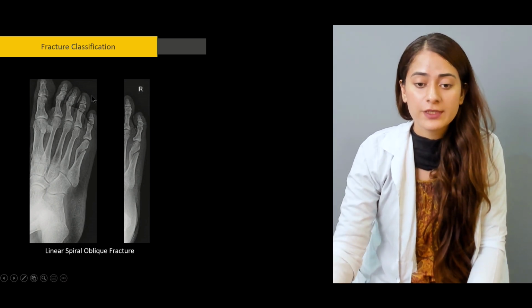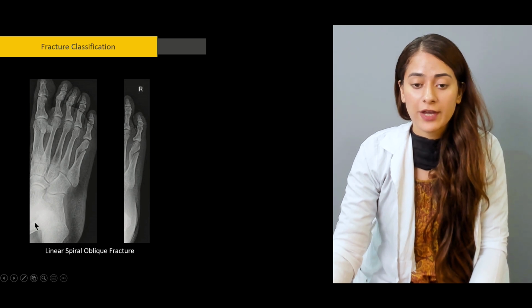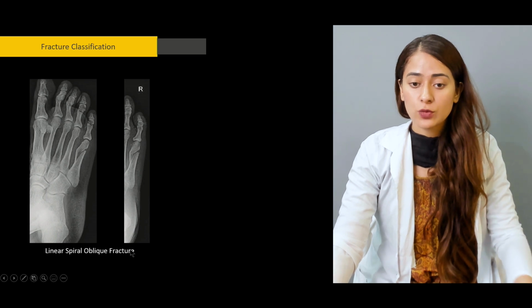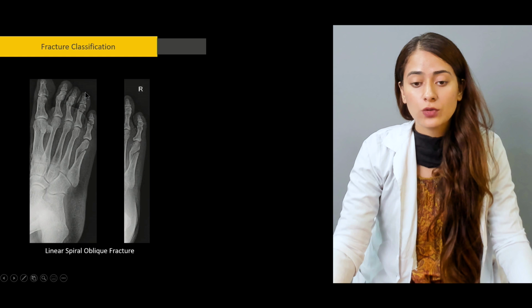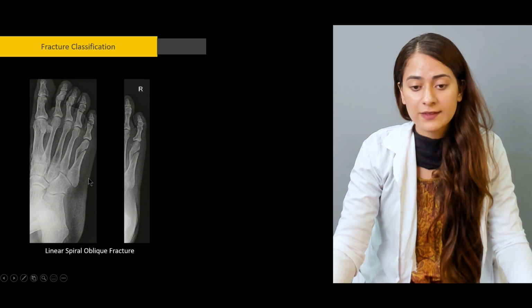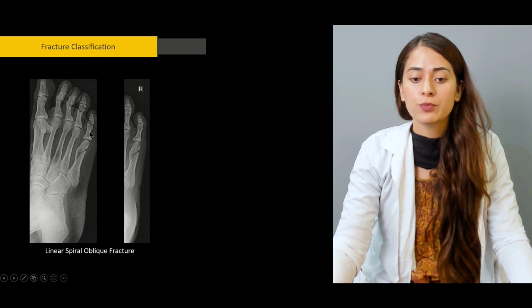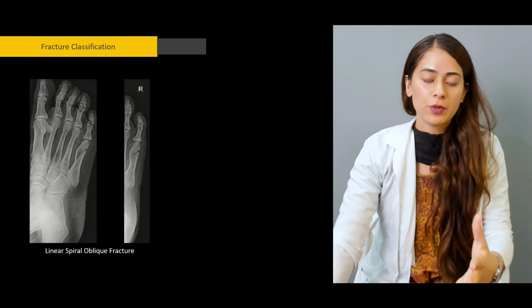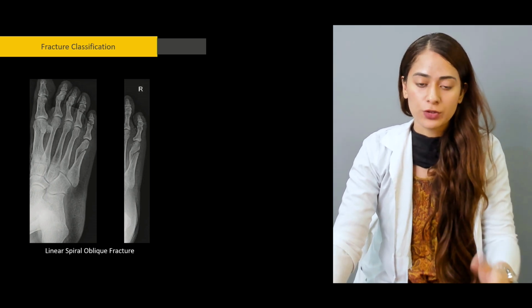Because in this radiograph, the main reason for this radiograph is to view this portion of the foot, right? So the focus is to make this little finger more prominent. So the placement of the body part or segment is in accordance with the structure that is to be viewed.